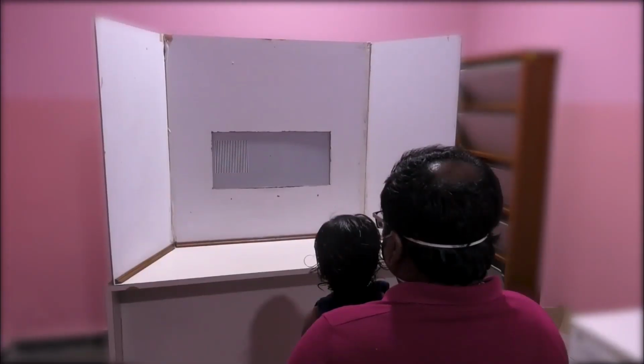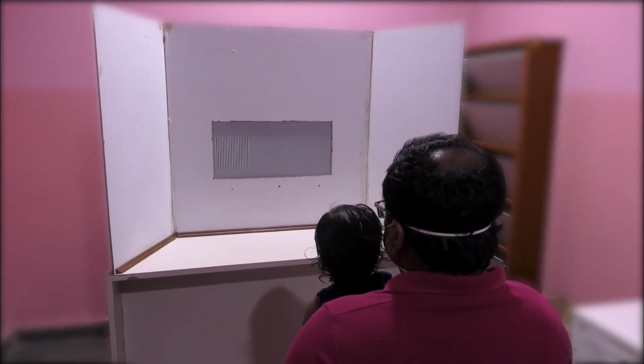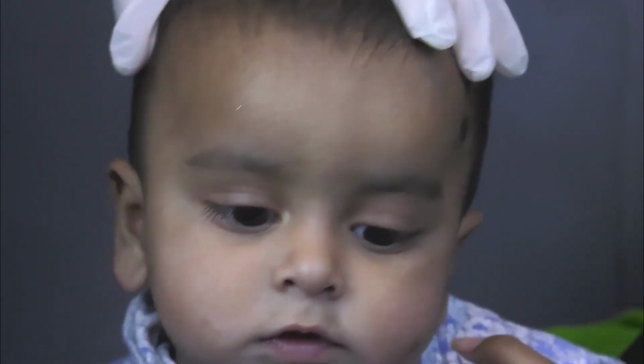The Teller visual acuity of the infant was 2.40 cycles per degree in both eyes, and he equally preferred either eye for fixation with no significant refractive error. On examination in the clinic, the infant was noted to have left eye mild ptosis with Marcus Gunn jaw-winking phenomenon and hypotropia. The motility assessment was difficult owing to poor cooperation of the infant in the clinic. There was resistance to occlusion of either eye. There was no pathology observed in the posterior segment with dilated fundus examination.